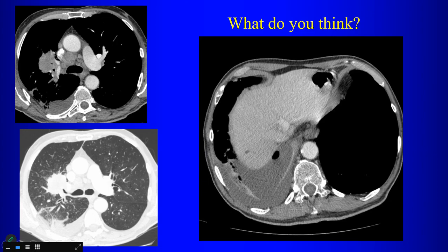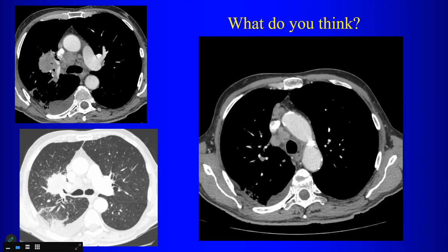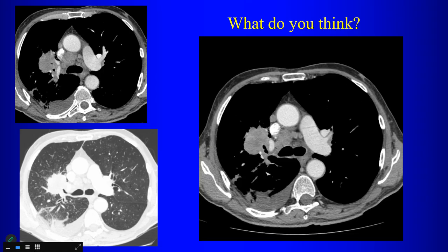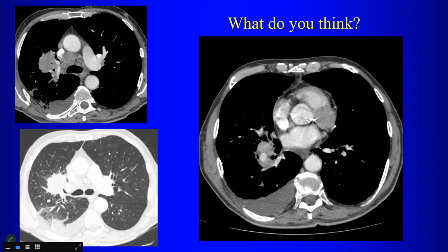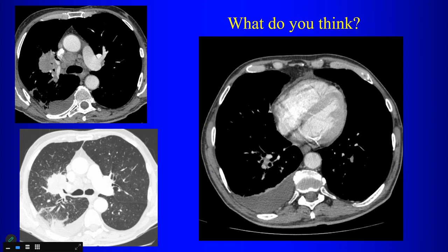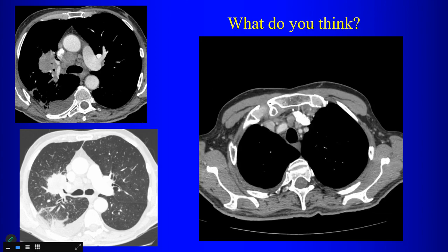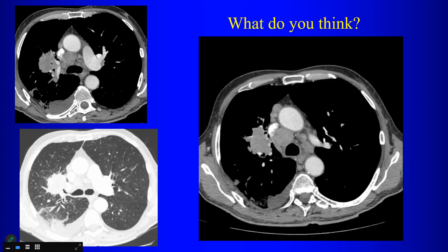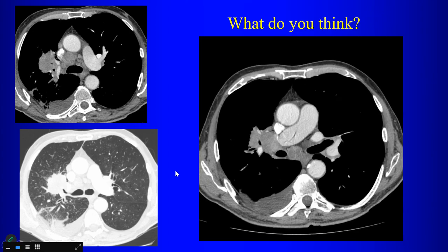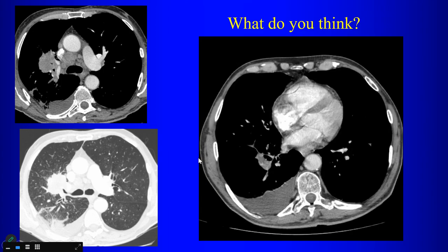So in outpatients with PE, the most common scenario is a patient with a cancer. So remember, cancers increase the risk for PEs. They make the patients hypercoagulable. In all outpatients with history of malignancy, when you're scanning the chest, look very carefully at the pulmonary arteries. These are patients where you might pick up relatively asymptomatic pulmonary emboli. They will still treat the patient for PE if you find PE on these patients, but look carefully. These are not PE protocols, right?